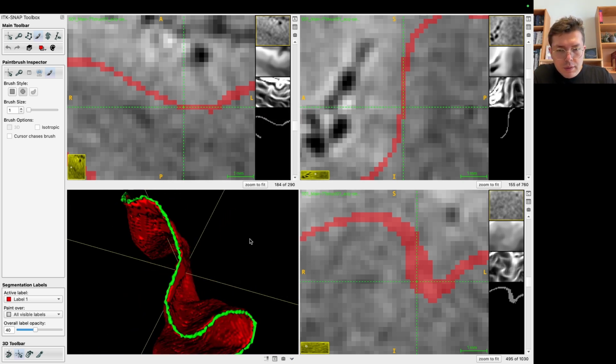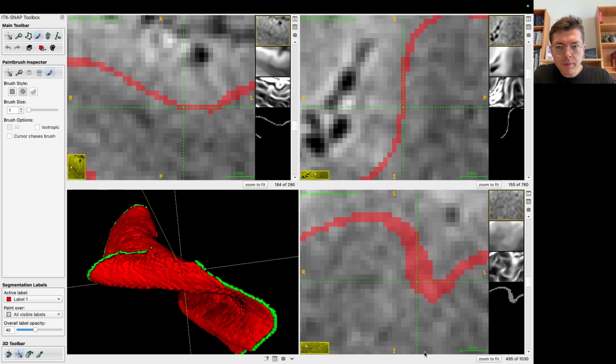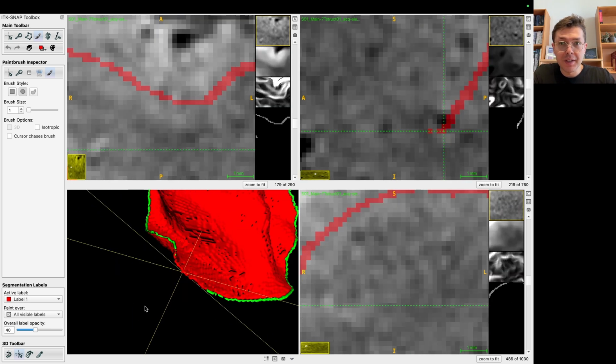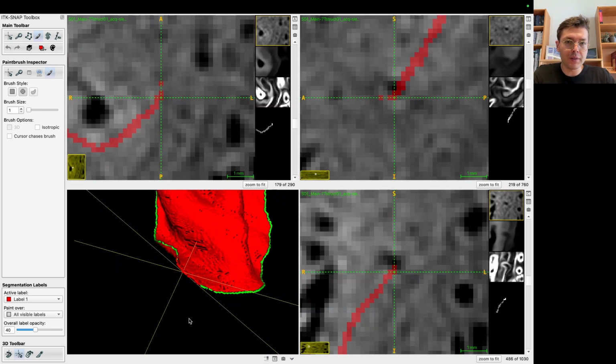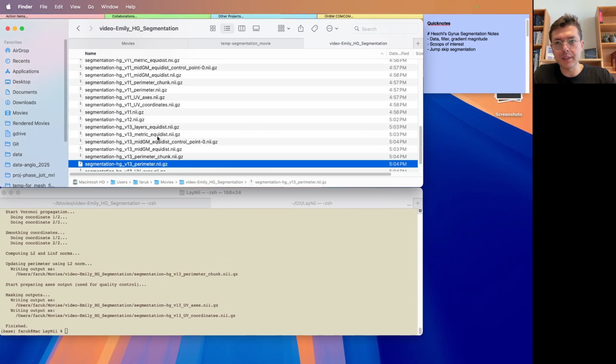Okay, I think now it is really continuous. All the greens. I'm trying to optimize the time, but of course, the moment you try to be quick and avoid some steps, things get harder.